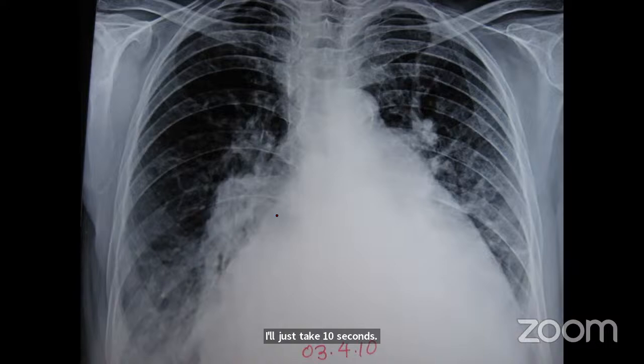So, as you can see, there is a huge heart. But before that, you see whether it is rotated. So no, it is not very well centered. Sometimes the lesion is quite big, the heart is quite big, so it may not be so significant. But if the heart is not so big, even a small rotation can cause our readings to be erroneous. So you can see cardiomegaly.